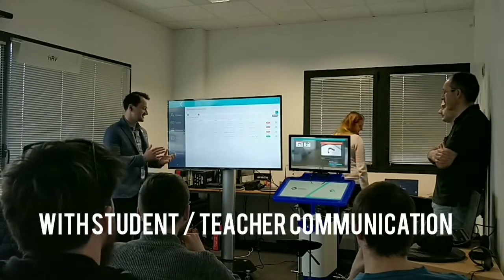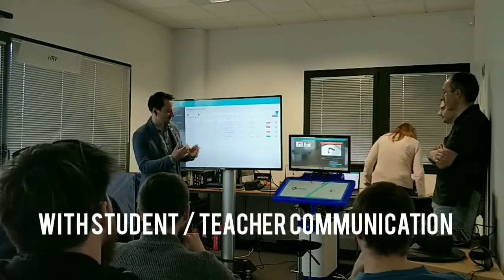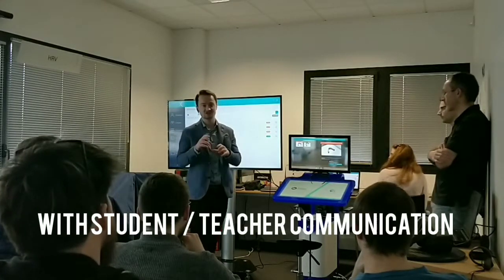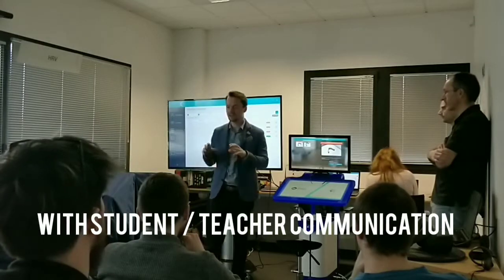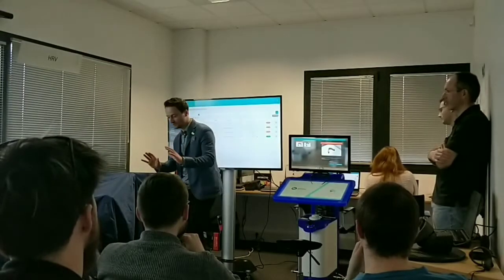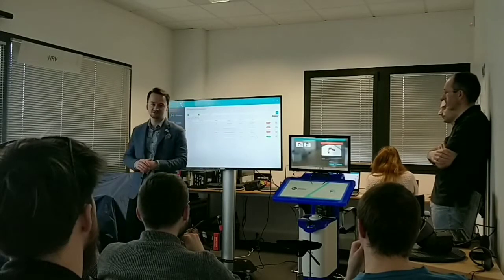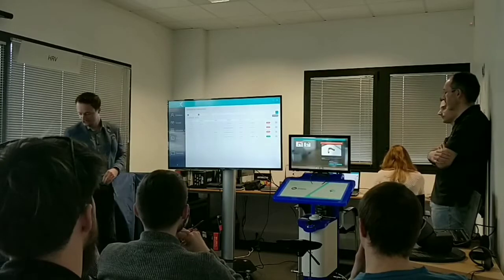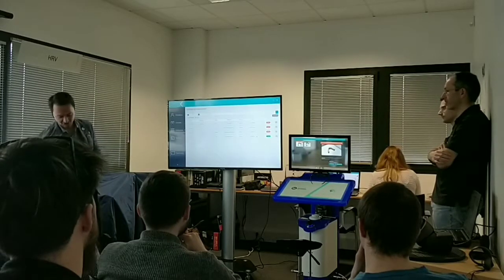So then, the next step is, outside of our standard library of exercises we've got, teachers actually have a chance to create their own exercises using our library of teeth or using new integrations with hardware within the university. So I'll change you over to our administration PC.